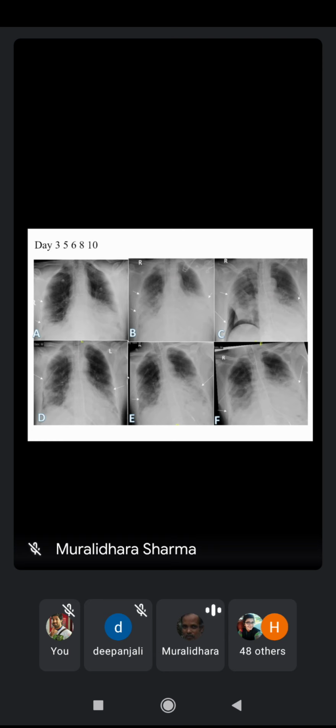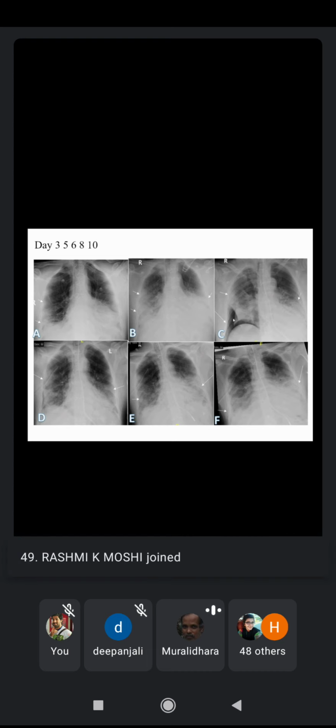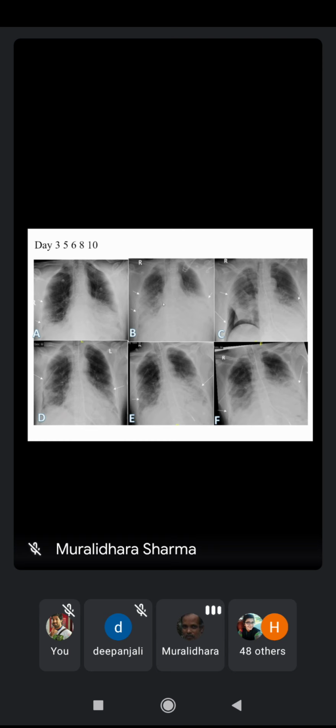Now one more example of the evolution of the COVID pneumonia, where you may have some more of the complications. These are not of the same patient. Images were taken at different durations, day 3, 5, 6, 8, 10, of different patients having different complications. Usually in the initial stages, only patchy lesions are seen. Later, those patchy lesions develop the interstitial phenomena, the patches with the fibrosis also.